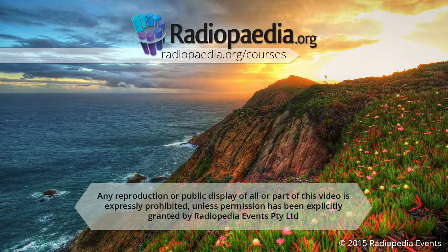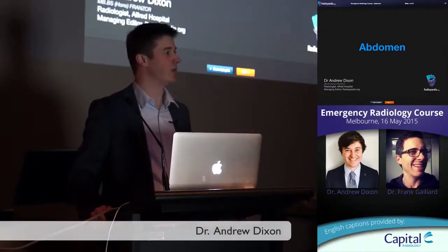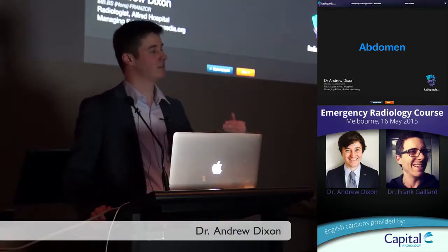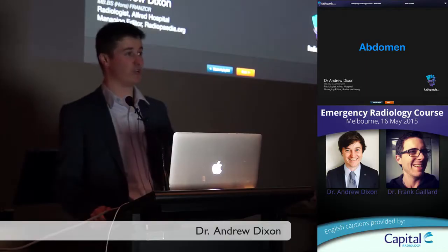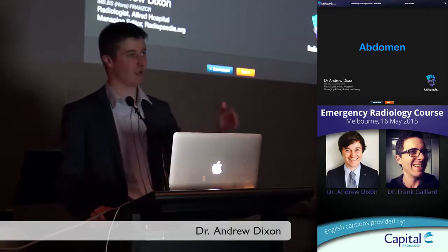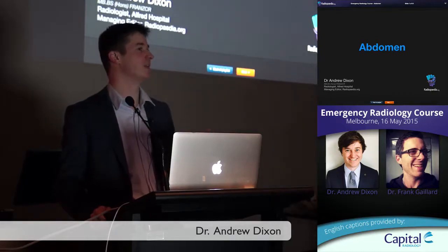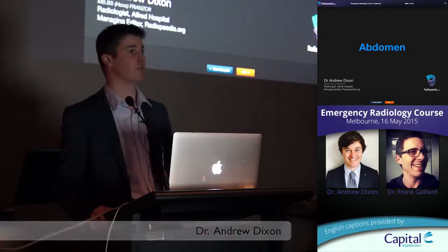The abdomen is very much focused on CT, and I just want to say at the start that I know where the pathology is, so I'm scrolling down fairly quickly to get to it. I'll try and point out some of the stuff and my thoughts as I'm going, but we don't really have time to be going through everything in a systematic approach. So that's the reason why we give you access to all of the cases, so you can look at them in your own time and work your way through them.